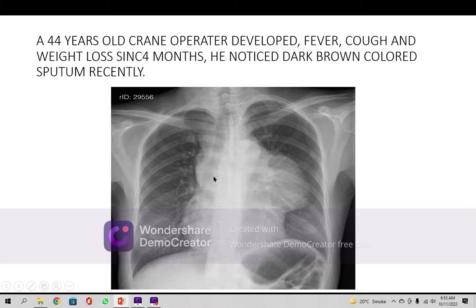The allergic reactions of sarcoidosis, the interstitial lung diseases and the parasitic invasions do not look like this type of reaction in the lung. So the most probable diagnosis is a mass arising from the mesenchyme, a mesenchymal tumor, which should be investigated further with the HRCT, and we go for the CT guided biopsy or bronchoscopy and take the sample and do the biopsy.